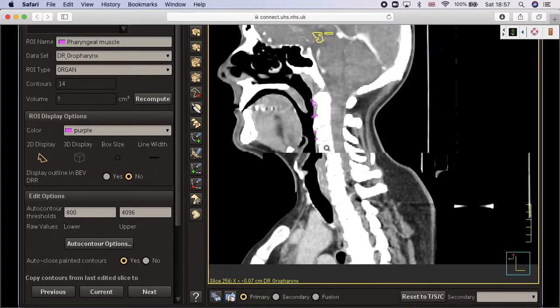Okay. So because we draw it in the superior middle altogether, when you come to C2, you can then stop and say, look, I will stop at the superior pharyngeal muscle here, and then I will start drawing the middle pharyngeal muscle. But honestly speaking, it's very difficult sometimes to differentiate between the middle and the superior pharyngeal muscle.